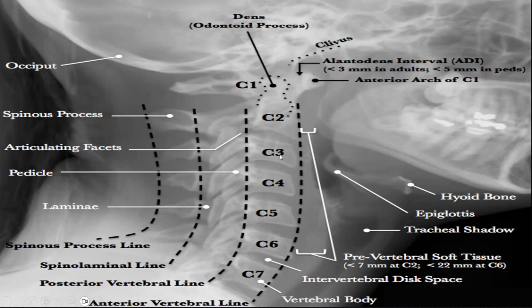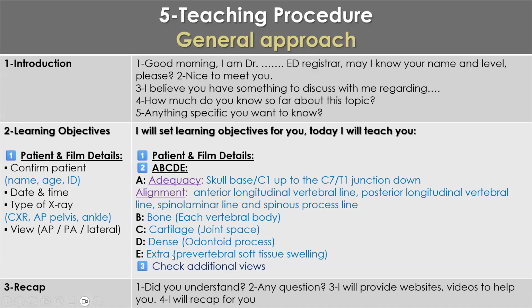Okay, if the height in the anterior and the posterior is short, with a fracture in the vertebral body, what does it mean? Burst fracture. Okay, if the fracture is in the anterior part and the inferior, an avulsion, it is a teardrop fracture. Okay, what is the next point, doctor?